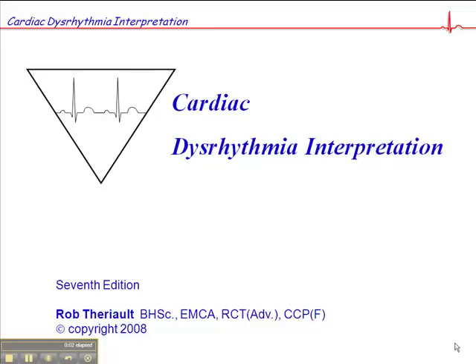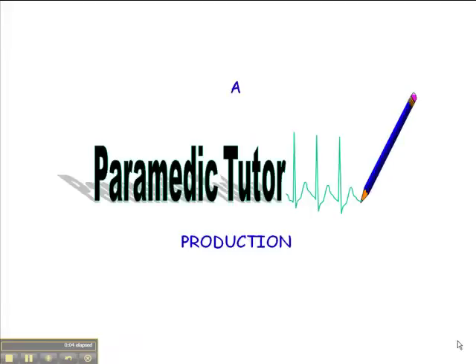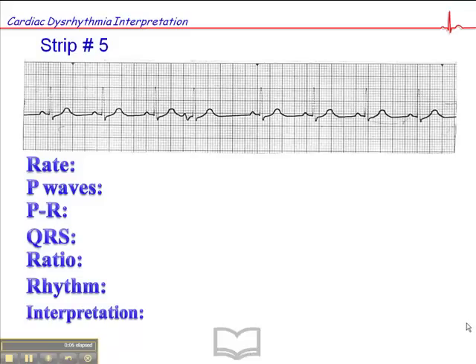This is ECG exercise number 5, and it's on page 87 of your workbook. So let's start with the heart rate here. The heart rate is approximately 70. Now you notice off the bat that we have a bit of an irregular rhythm.